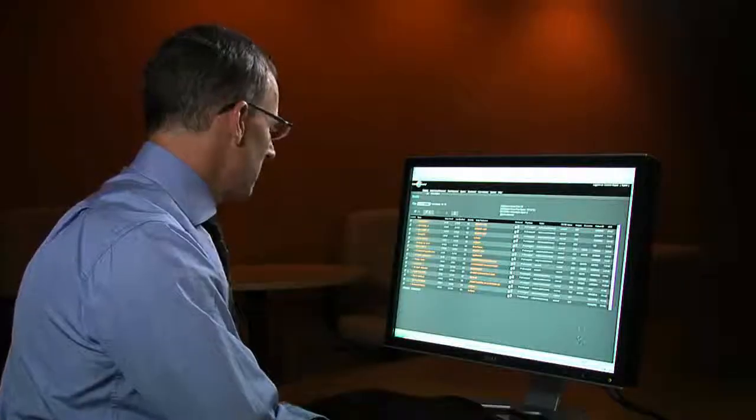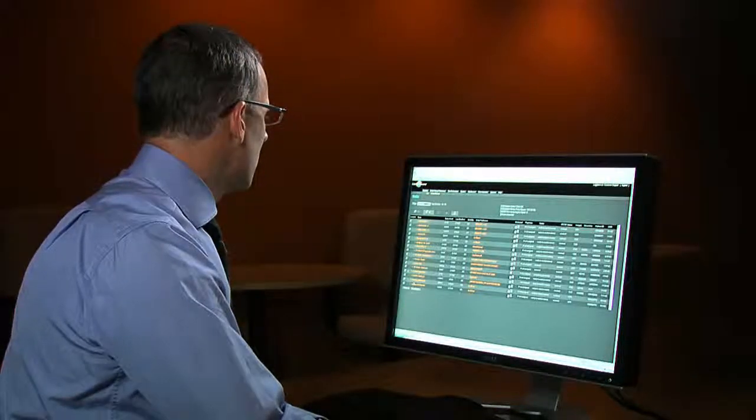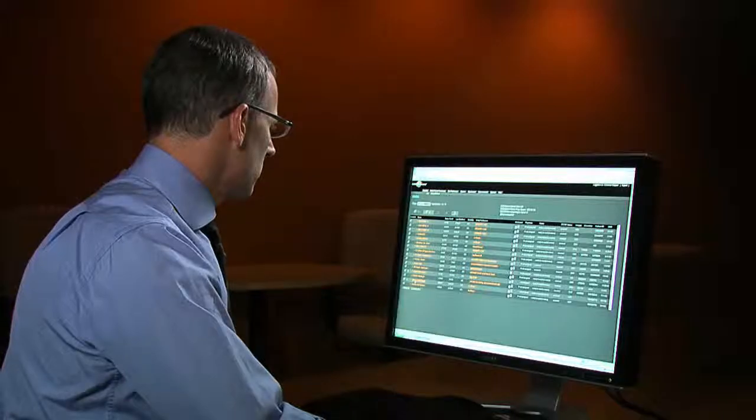For this next case, I'd like to show you an example of one of the features of CAD software that will make your life much, much easier. It's an example of a patient who had come in for a staging breast ultrasound and was found to have a very large cancer on one side.